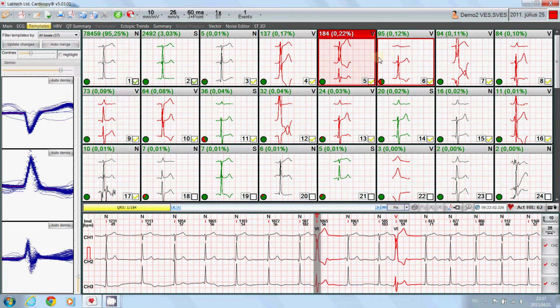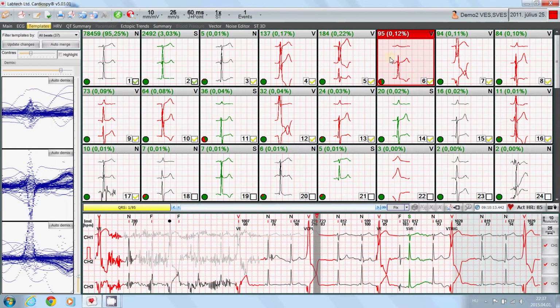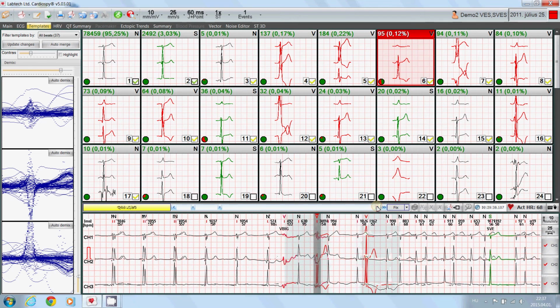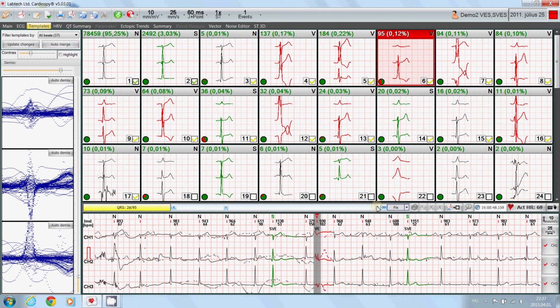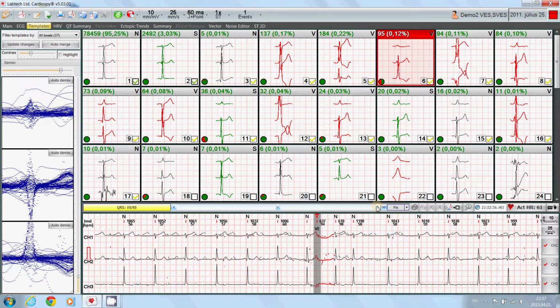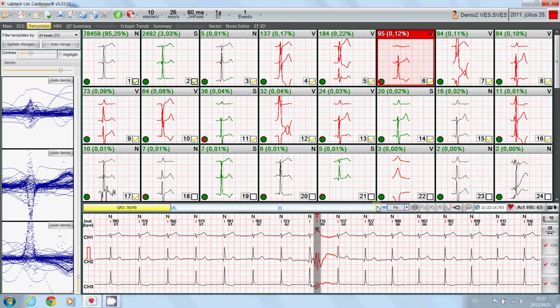The fifth one looks okay, just like the sixth, which is mostly okay, however it contains lots of noisy beats, which normally you would want to fix, but I will not do it in this case, because I've already shown you how to do this.